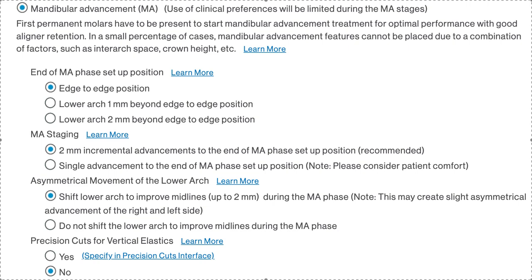It's Dr. Amanda with Straightsmile Solutions, straightsmilesolutions.com, and a lot of you are asking me this week for some reason about submitting MA cases, making sure you're clicking the right bubbles. I probably have a video about this somewhere, but I couldn't find it. If I did, I might have named it something else. So I thought I'd make another one. Plus, I think they've changed this a little bit since when I first made my initial MA videos.